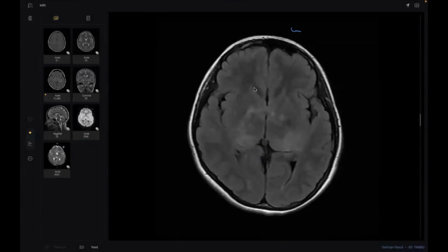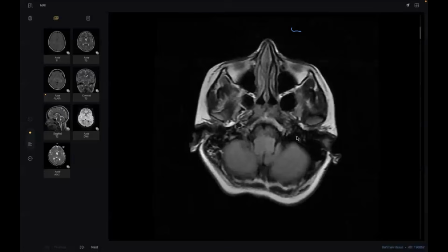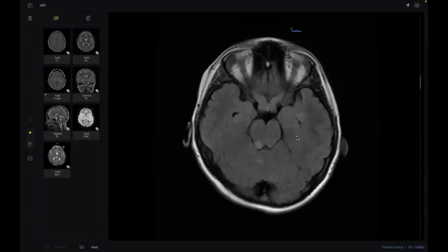You have something here, but you are stuck now in your diagnosis. Could you have a general look at the rest of the exam? You may find any other finding that can complete the picture and clear up the diagnosis in your mind. I'm trying to look for any evidence of internal cerebral vein involvement, which can also cause this in this slice.